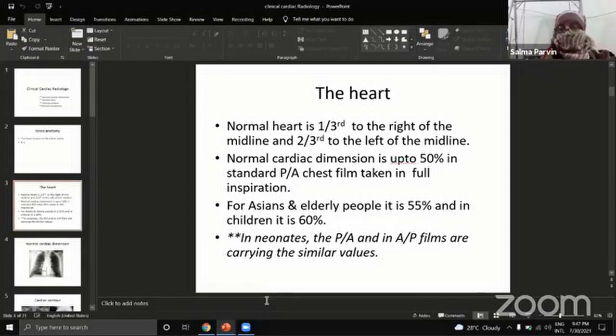So whatever 50% or 60% you are going to produce, you are going to decide from a chest X-ray, you must go through the standard inspiration status of the X-ray. How is it possible to understand whether this X-ray is taken at the height of full inspiration?